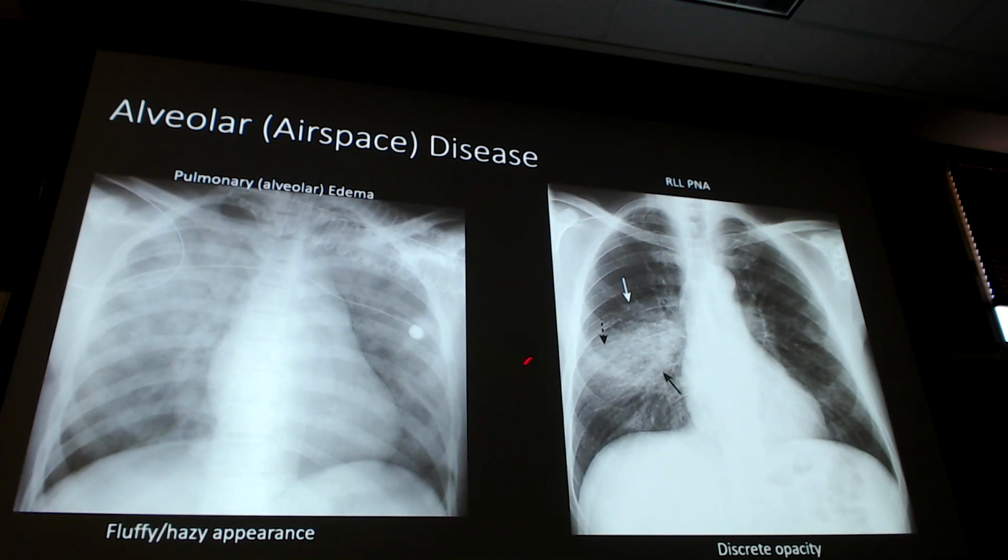And then over here, we have a pneumonia. Okay? It's nice, it's kind of isolated in an area. This is where I say it could be localized. That pneumonia will get worse if it goes untreated. But then my question is, if you didn't see this up here, what lobe would you say this is?